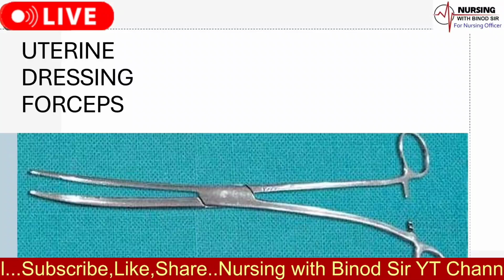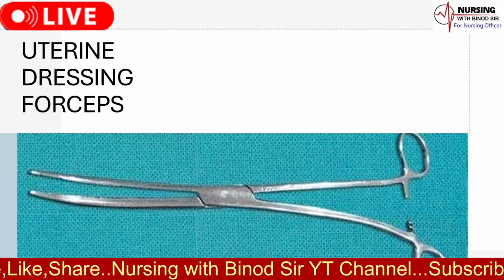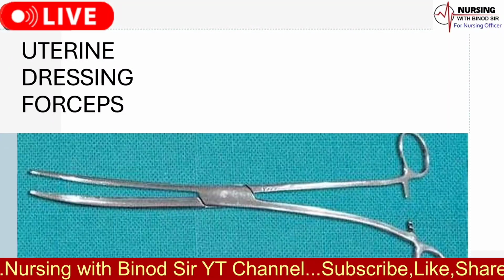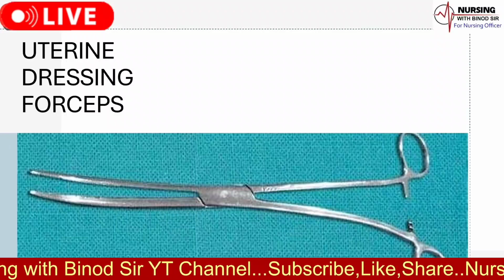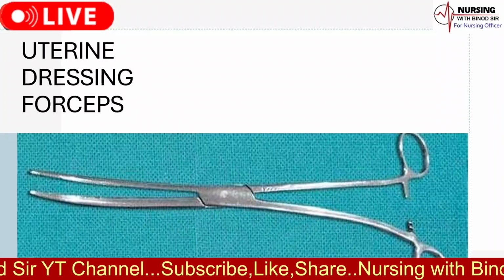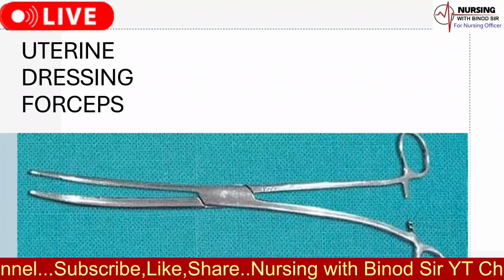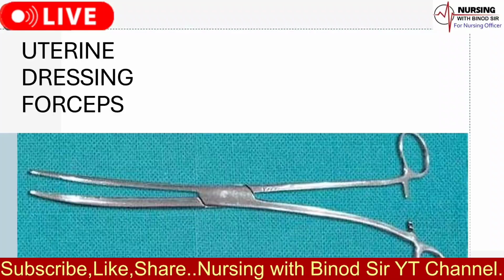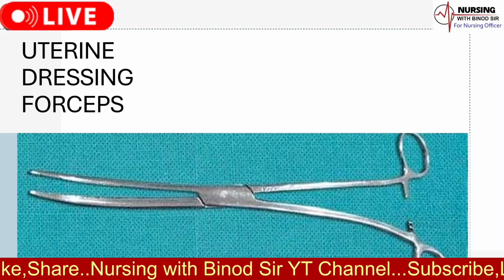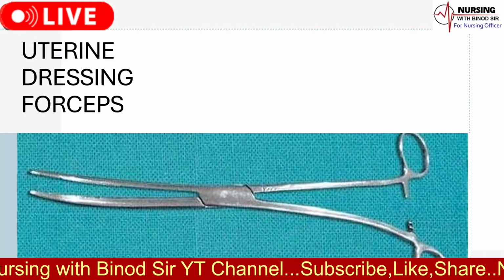The name of the instrument is uterine dressing forceps. The uses of uterine dressing forceps are as follows. 1. Placing and removing dressings. These forceps are commonly used to place and remove dressings in the uterine cavity. 2. Manipulating tissues. They help manipulate delicate uterine tissues during various surgical procedures. 3. Grasping and holding tissues. The serrated jaws of these forceps securely grasp and hold tissue to prevent slipping.